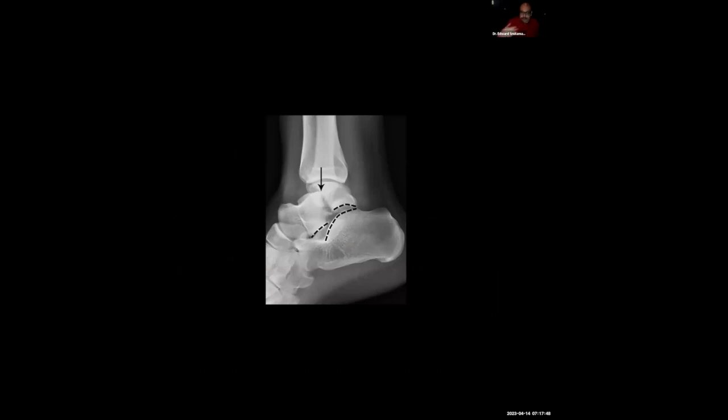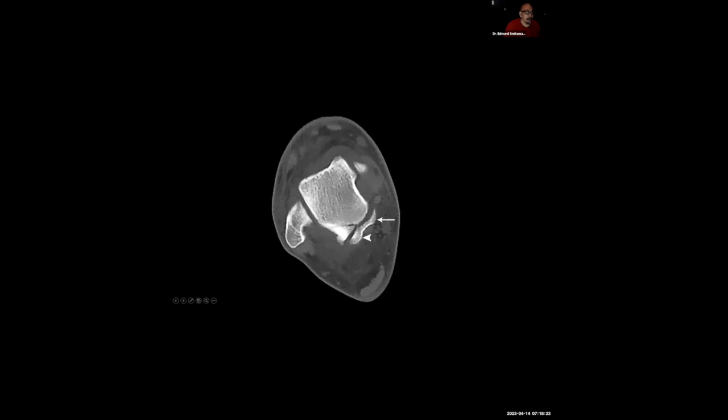Moving right along to some talar body shear fractures. Okay, these are thought to be caused by a hyperdorsiflexion and an axial load of the foot, resulting in these fracture lines that extend typically through the talar dome. Okay. Isolated shear fractures are uncommon, but they can happen in the coronal plane, as we see here, okay? Sagittal or even horizontal, but also notice here in this coronal shear injury, right, how there's involvement of not only the posterior joint, but also the tibiotalar joint, okay?